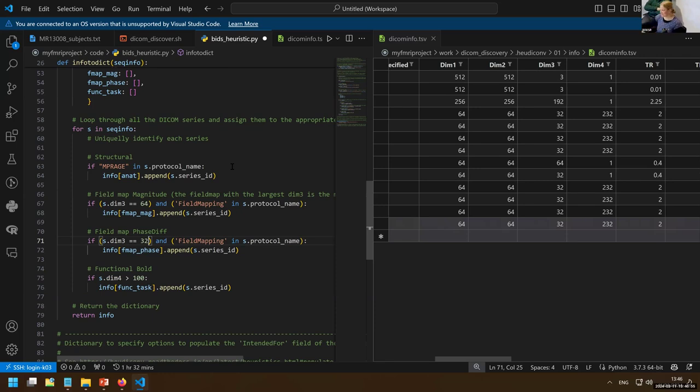There's always manual error. The nice thing about HeuDiConv is that if it works for a complete case, where you know this particular participant has all the scans and the data exists where it's supposed to be, and then it doesn't work for another one, you can start doing some detective work.